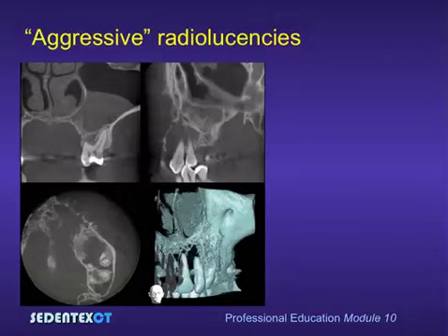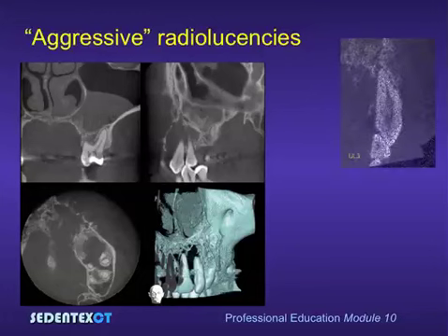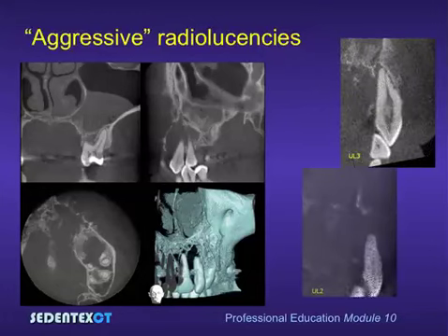This is the same patient on the 4 principal planes. And here are some cross-sectional images. Note that the teeth themselves probably haven't been disturbed from their normal positions. They appear to be floating within the abnormal tissue. There is extensive ragged bone destruction.